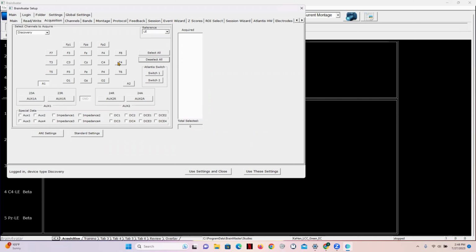In this case, we are going to choose F4, F8, C3, C4, and T4.